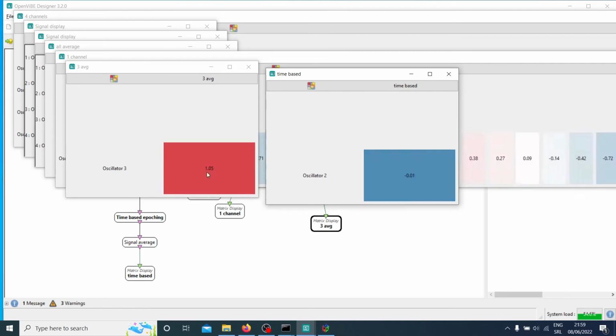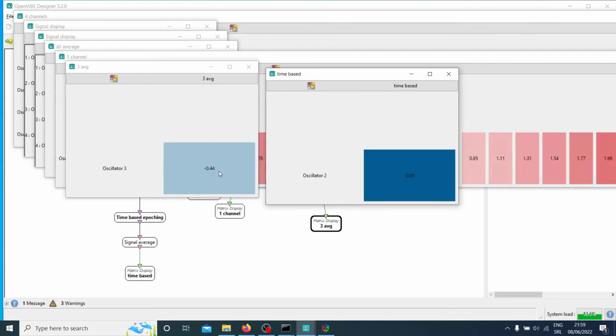So we're giving one value here every 256 divided by 32 times, and here we're giving it every half a second. We can also do it so that we're averaging a whole second but displaying every half a second. See?